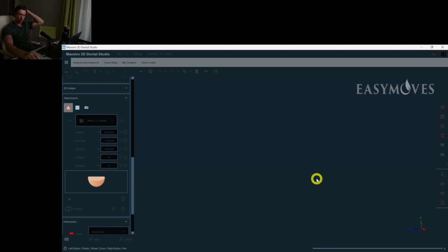It's okay for us to combine the translation with tipping.